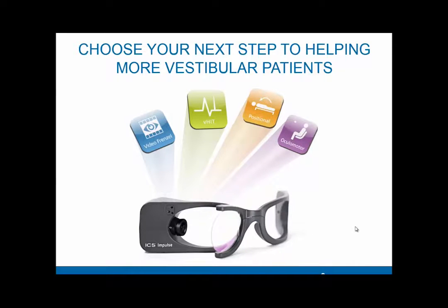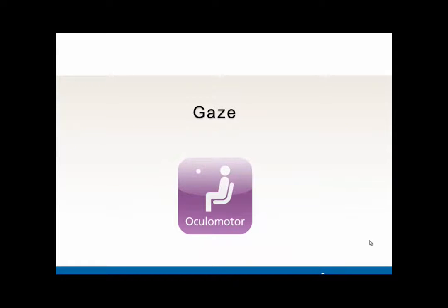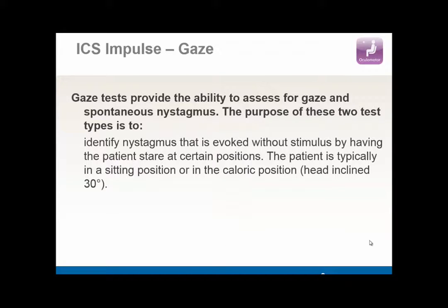I'm Wendy Crumley-Welsh, the product manager for ICS Impulse, and today we're going to be talking about gaze. The gaze test, which includes gaze and spontaneous, is in the ocular motor module. Gaze tests provide the ability to assess for gaze and spontaneous nystagmus.